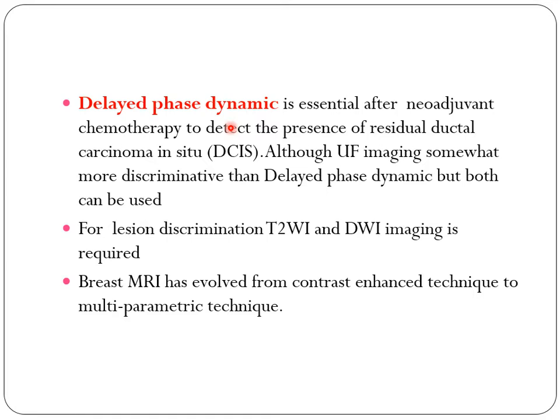Here's the delay phase dynamic evaluation. Delay phase dynamic evaluation is essential, especially for the neoadjuvant chemotherapy, to detect the presence of residual ductal carcinoma in situ, in which there is a breast lesion and we will give neoadjuvant chemotherapy to the patient. In order to evaluate the response to the neoadjuvant chemotherapy, it is better to do a delay phase dynamic evaluation for the patients by the breast MRI.